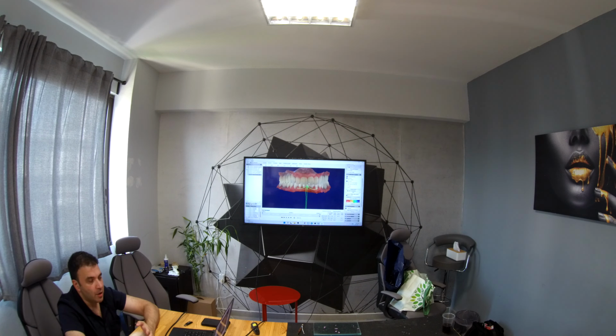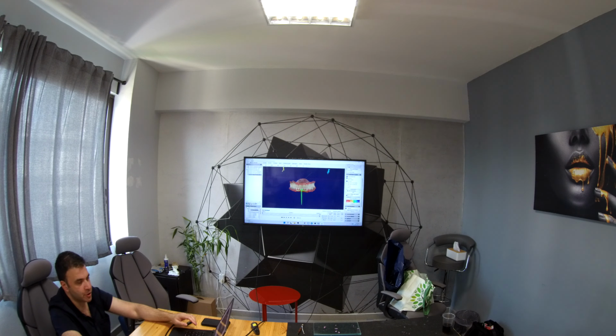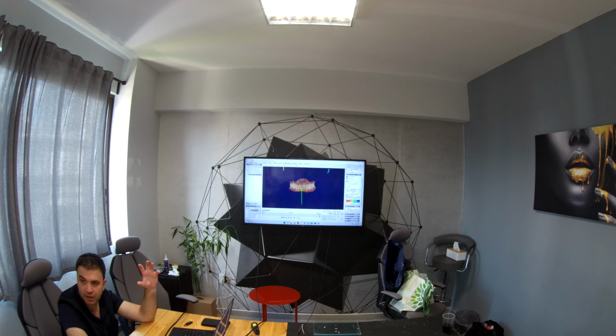And right now, what information can we get from here? As I showed before, that's why I'm showing these cases right now. Let's see this. I switch off the eye with the left mouse button, and I leave active only one of the movements. You see the eye is bright, it's dark. Whatever is dark here, it means this is what we are investigating, what we are seeing right now. If it's pale, it means it's switched off from the screen. We don't see it.